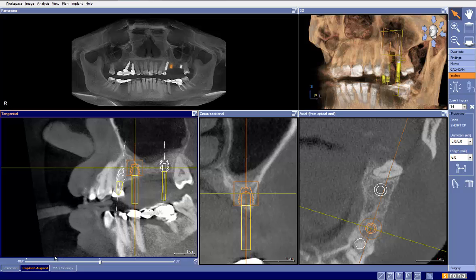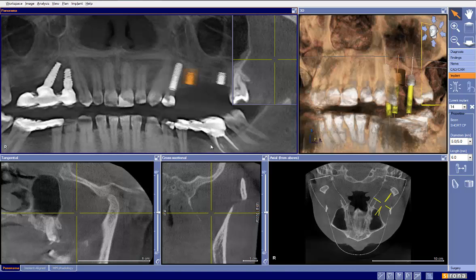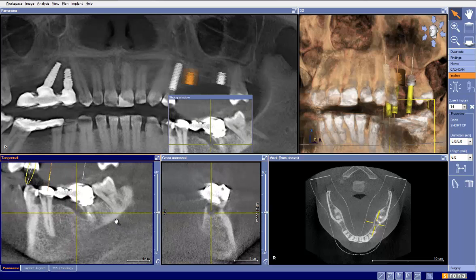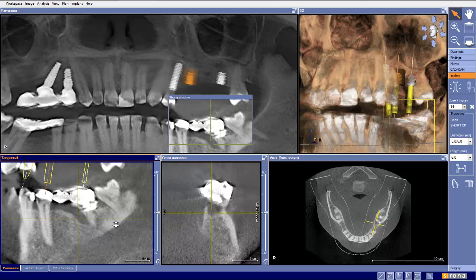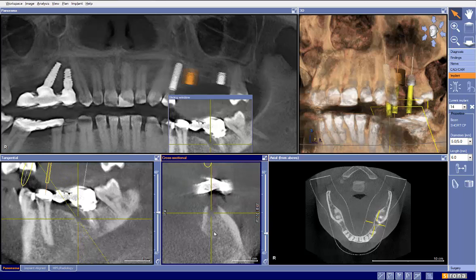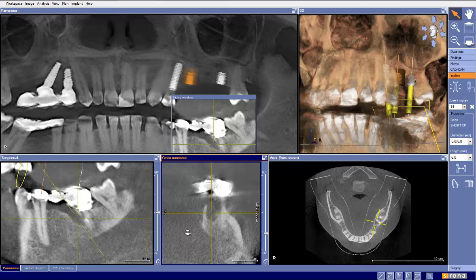Okay, let's go ahead and take a look at the implant bridge here. Before we begin, I want us to notice tooth number 19. If we take a look here, we can start to see that tooth number 19 actually has a pretty reasonable sized defect right here. We can take a closer and better look at it by using our tilt tools here.